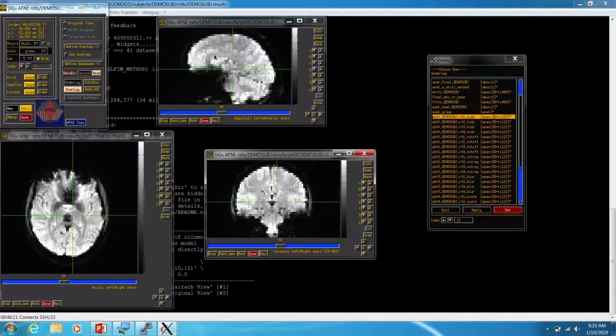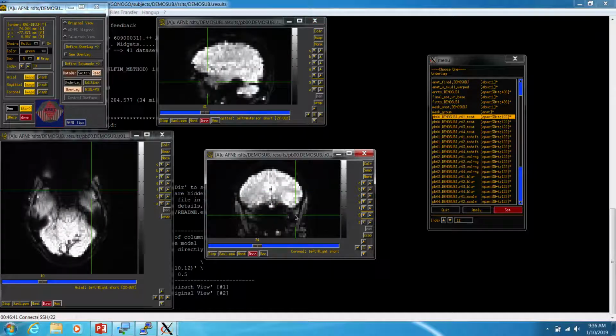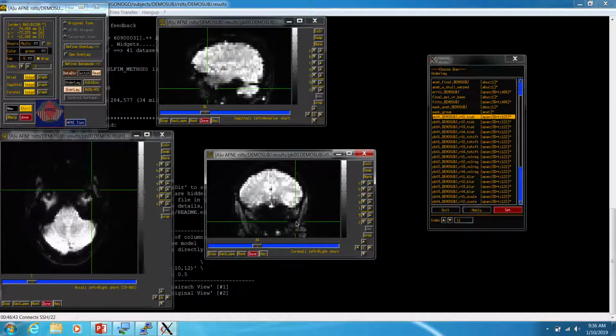So a lot of our pre-processing steps help address that. Primary amongst them is warping to the template space. The other thing you'll notice is this image isn't really aligned. This is the front of the brain and this is the back of the brain, but it's kind of tilted like this. This is because to be comfortable in the scanner, you have to lie back a little bit sometimes. So people aren't perfectly aligned. But you can see that a lot of the oxygenated blood is very clearly in the brain. There's a pretty strong delineation compared to over here, which is not in the brain. So there's some blood in the tissue, but your brain uses a lot of oxygenated blood to run its functions.